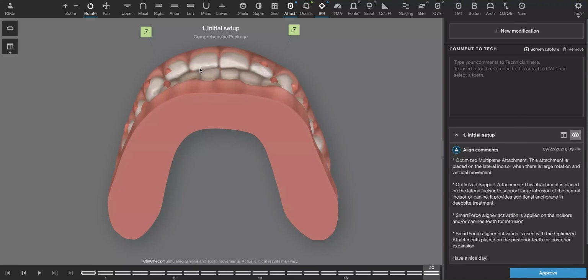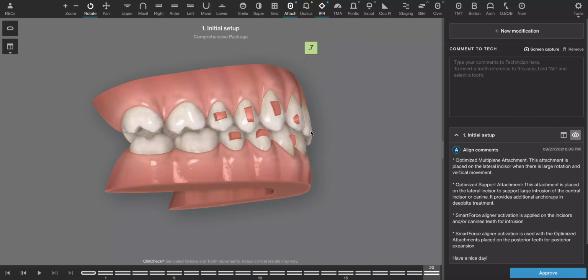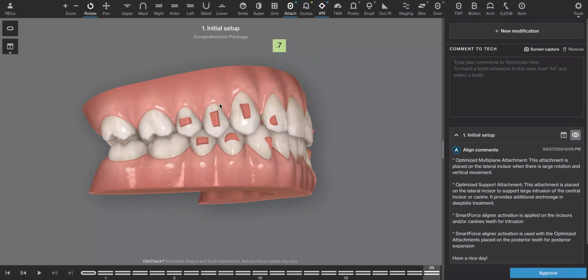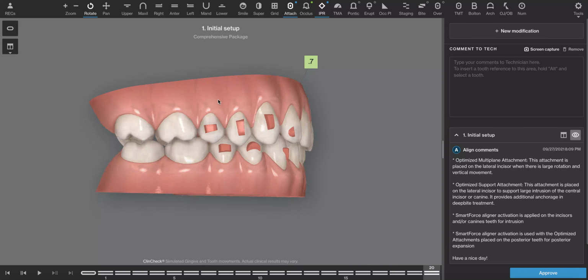This looks a little bit trapped to me. I would ask the lab technician to procline the axial inclination of the front upper 4, so the upper 2 to 2, by another 10 degrees, creating a millimeter overjet. So create some space here. That will increase the restorative space needed here, but that's going to remove the potential for entrapment that we're trying so hard to fight in our patients that need full mouth rehabs. We know what entrapment can do to the gnathologic system, so we don't want to create a problem that's not already there.